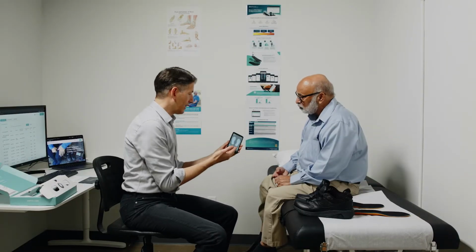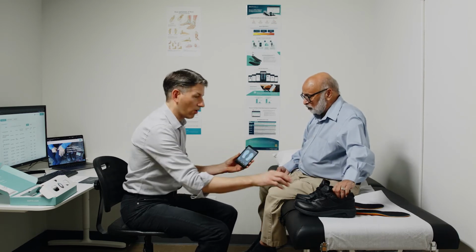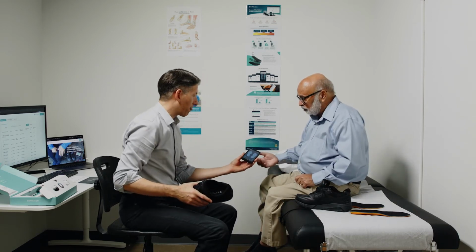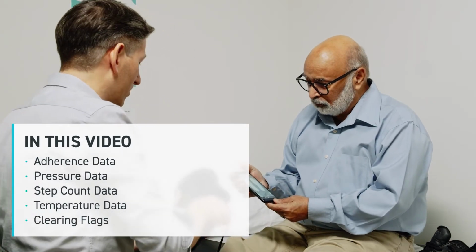Welcome! This video series provides the information needed to maximize the use of the Orpyx SI Sensory Insoles. In this video, we will explain how to interpret the data you will see in the Orpyx dashboard.